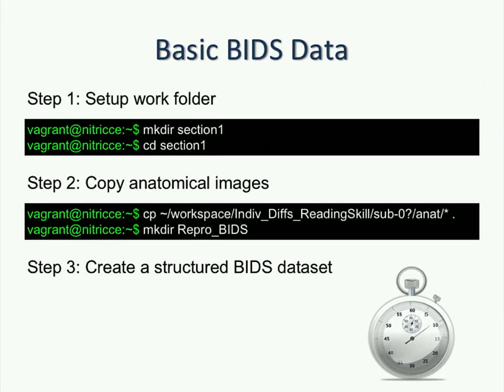The VirtualBox already has some data on it. Open a terminal window. In your VirtualBox, with the terminal window open, these commands are in the PDF file too, so you can have that open right next to you. You can copy and paste from the PDF into your VirtualBox, or you have to type. On my Mac, I have trouble copying and pasting between the Mac and the VirtualBox.